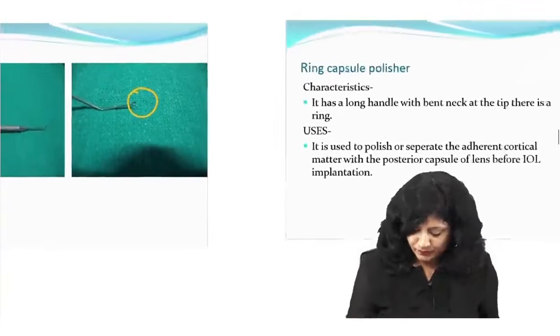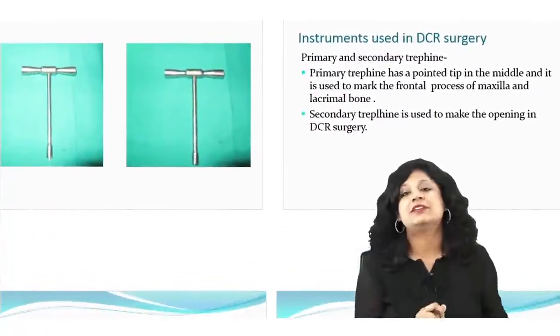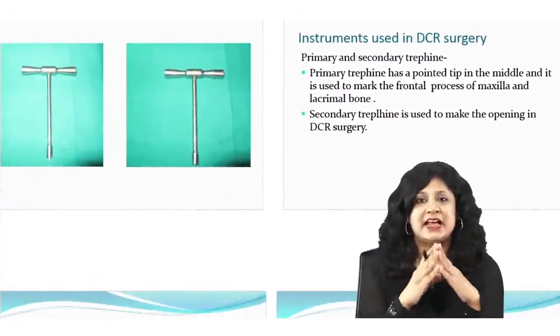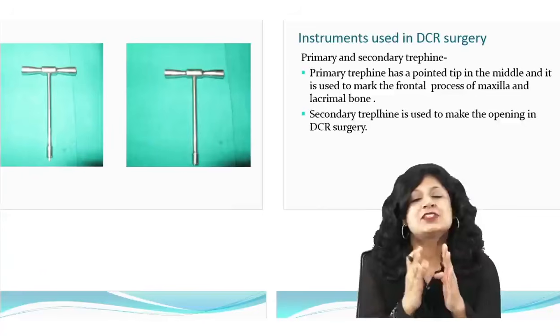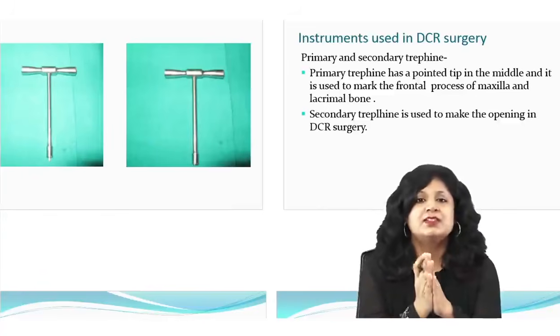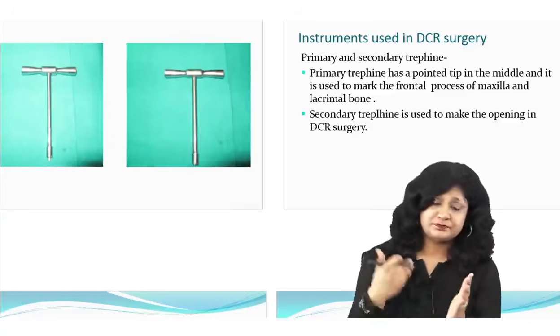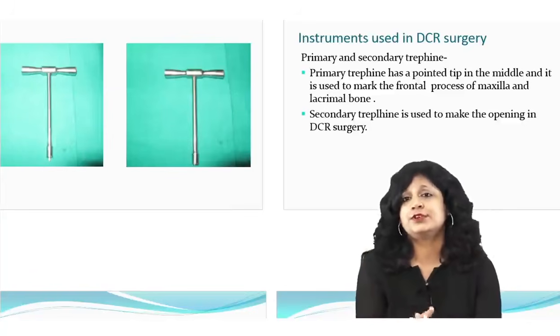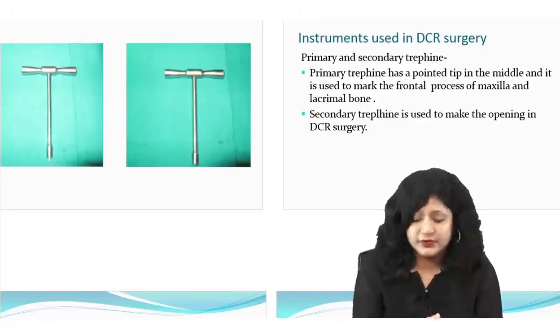Okay, now we are coming to the instruments which are used in the DCR surgery. Now though DCR surgery is much less common in comparison to the cataract surgery, because this is also an ophthalmology surgery, let's take a quick look over these instruments.